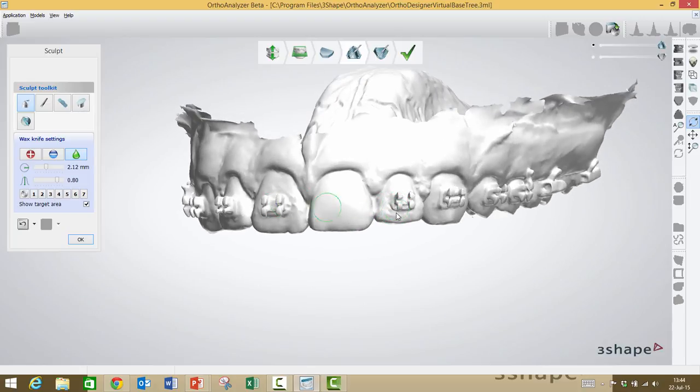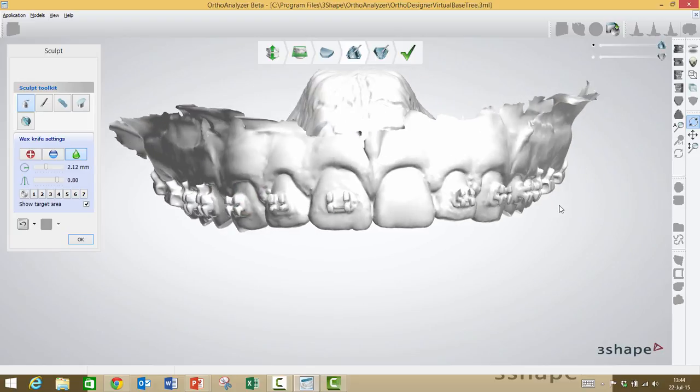Yeah. As we said before, by debonding this, you can debond all the brackets on the patient here, and so you can print out the model set and make a retainer to give the patient for the last visit. When you're debonding all the brackets, you have a retainer to give them. Perfect. At the same time.